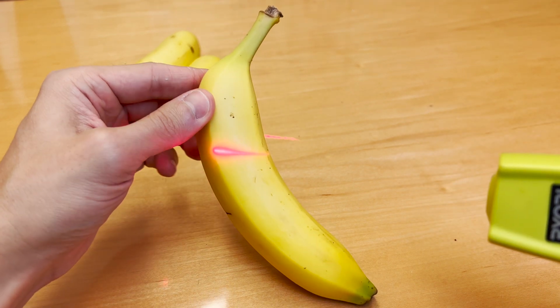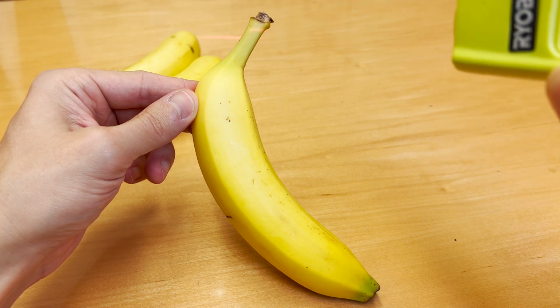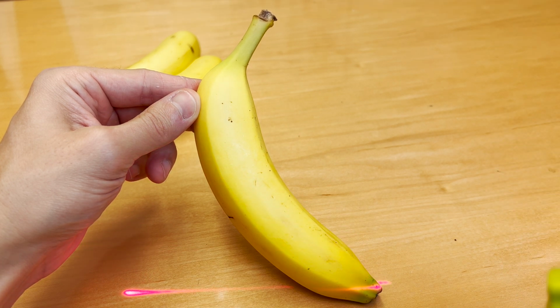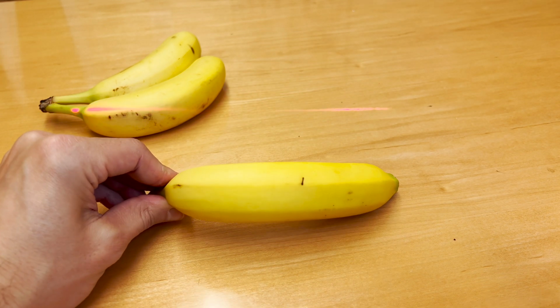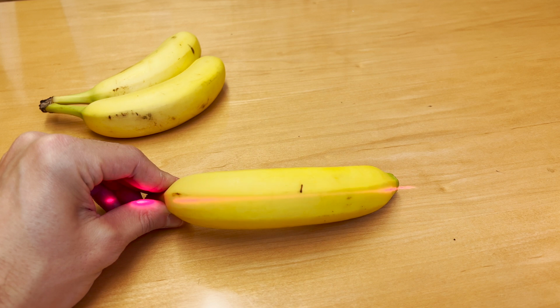So if we hold the banana actually fixed in space, we can see as we make cuts through the banana, we can see how the cross-section would change if the banana is held in this orientation, just like that. If we held the banana in this orientation and made cuts through it, you can see how the image cross-section would change with the banana like this.